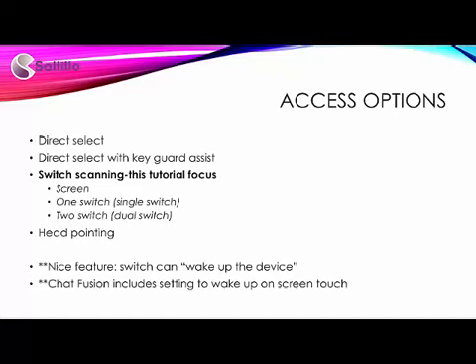A nice feature with scanning is the ability to wake up the device with the switch activation. Chat Fusion also offers the ability to wake up on a screen touch within the settings. First, I will be describing the switch methods, then offer a demo, and finally walk through the setup. I will be using NovaChat devices and Chat Fusion for the demonstrations.